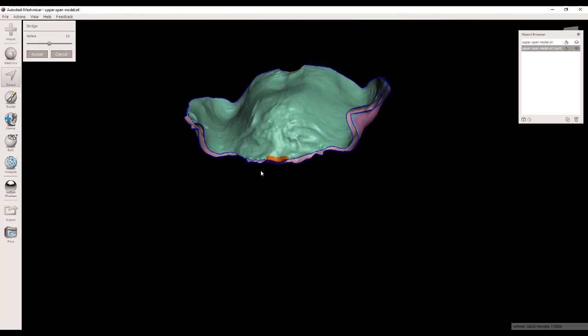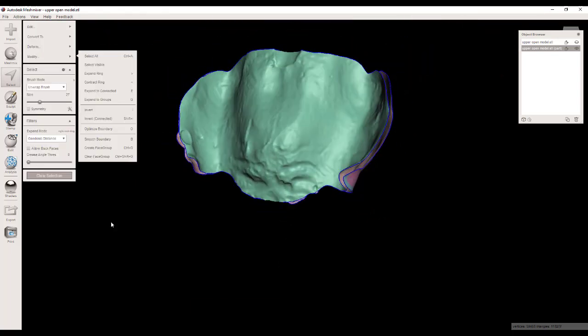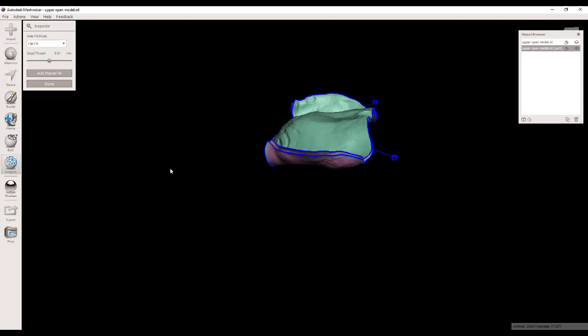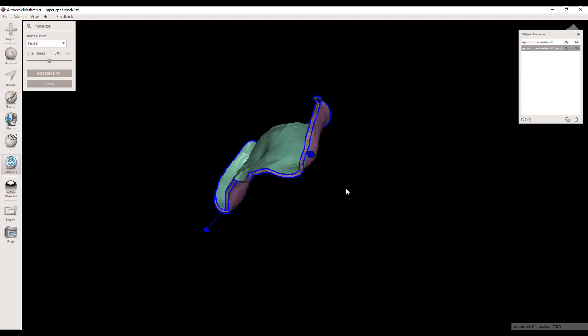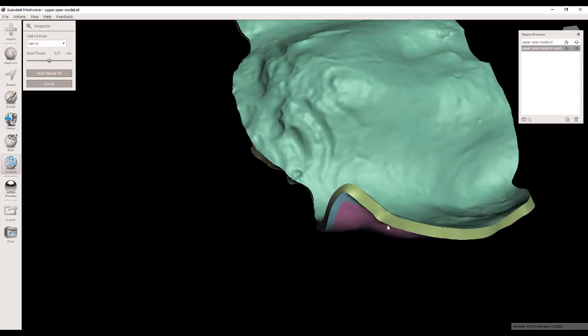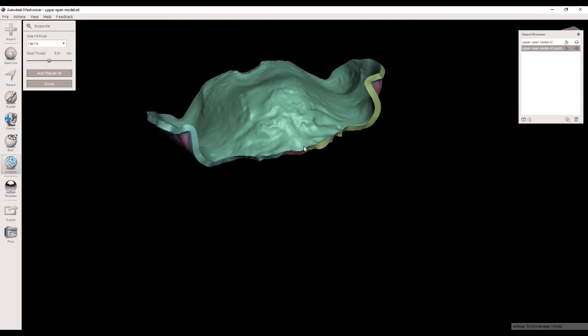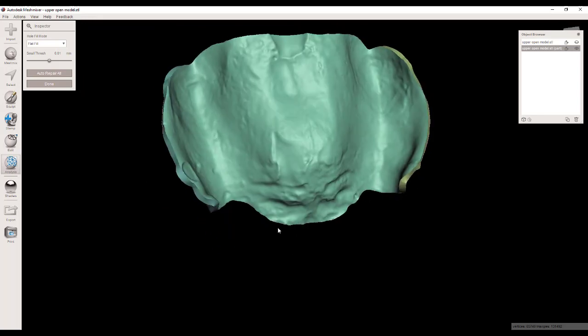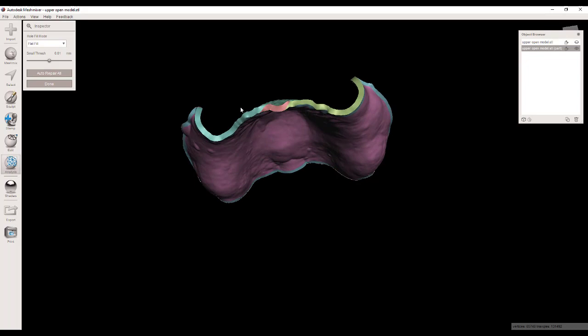So again, now if you were to run the analysis inspector, what you would see is that there's going to be just two individual holes. Okay, this is a hole, this is a hole, and now if you just let it repair, the software will repair all of those. And there you have it. So this is one great option. This would be a good record base, no edges to smooth out like you would have had to using the extrude tool. So that's option one.